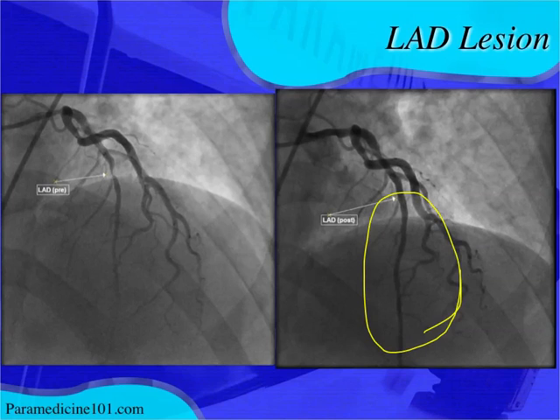Okay, and it can happen where you have ST elevation in the inferior leads from an LAD or a circumflex occlusion, and you just got to think that not everybody's vasculature is the same. Okay, the body does not read the textbooks, and your blood vessels on your heart are going to be different than your brothers or your sisters or anybody else out there. It's almost like a fingerprint. Okay, now typically we kind of generalize and we'll say that the inferior wall is usually fed by the right coronary artery and the anterior wall is usually the left anterior descending, but things can be different. Okay, so this kind of proves to you that you can have ST elevation in leads that don't really correspond with each other.